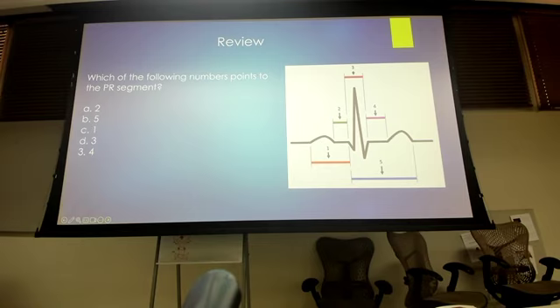Okay, so where are you? Which of the following numbers points to the PR segment? 2, okay, very good, 2. Now, I will tell you what often happens. People get confused with the PR segment and the PR interval.